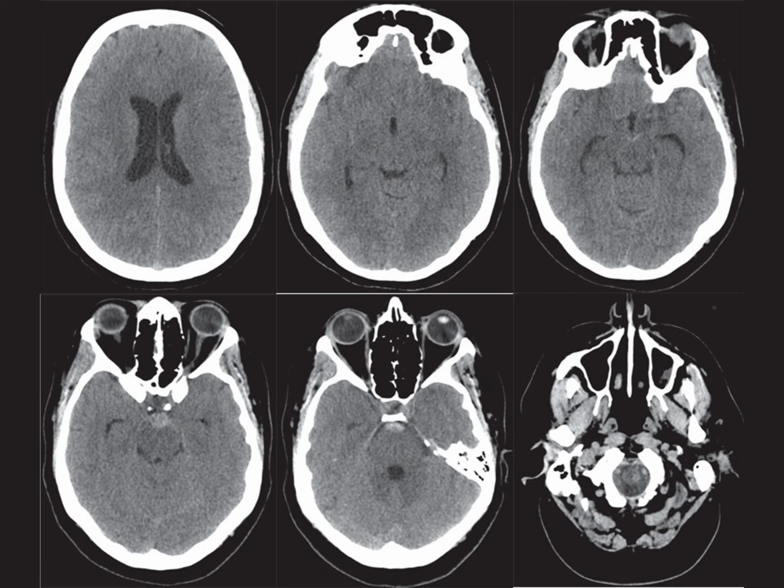On closer inspection, I can see high attenuation material in the prepontine cistern, extending anteriorly towards the region of the cavernous sinuses. This finding is quite significant and raises concern for potential intracranial pathology. Additionally, the lateral ventricles appear more prominent than expected relative to the size of the sulci, which might indicate the development of early hydrocephalus. The cerebrospinal fluid space at the foramen magnum appears satisfactory, which is reassuring.